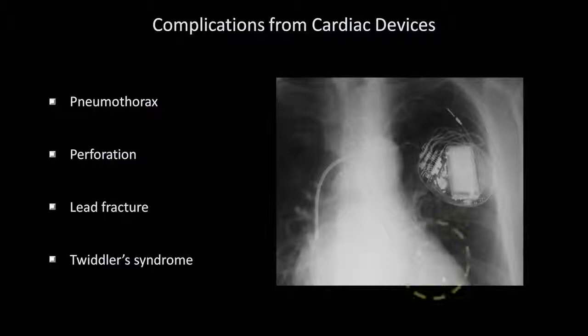Also visible in this X-ray are epicardial pacing leads, which function the same way as conventional pacing leads do, but which are placed by cardiothoracic surgeons at the time of either bypass or valve replacement surgery.